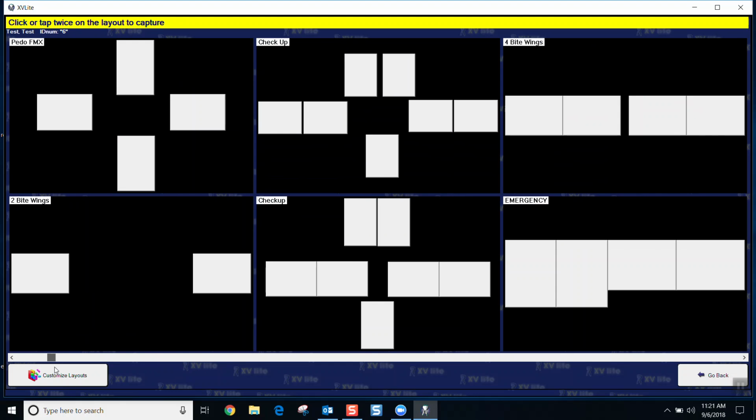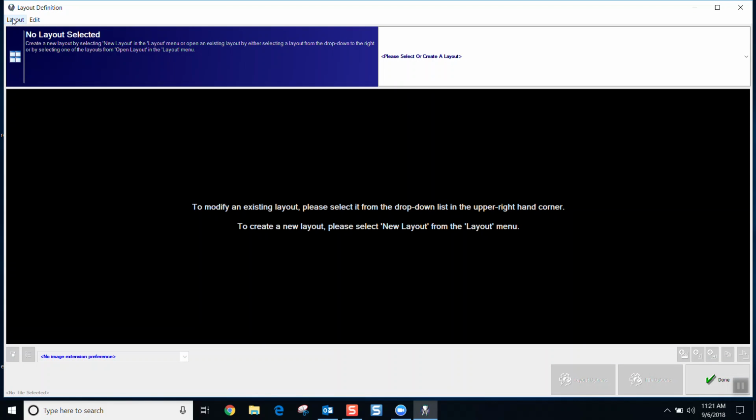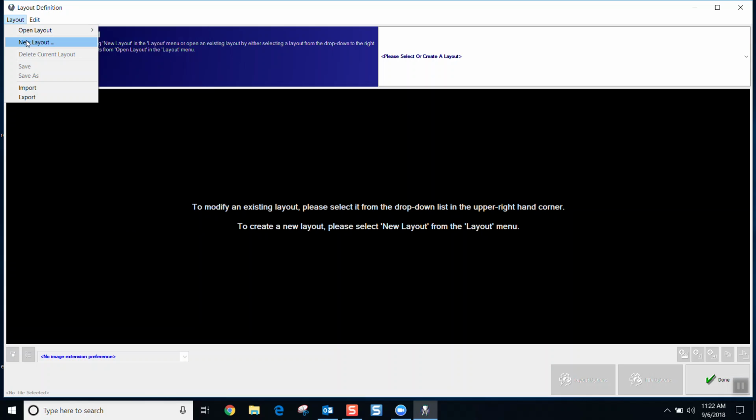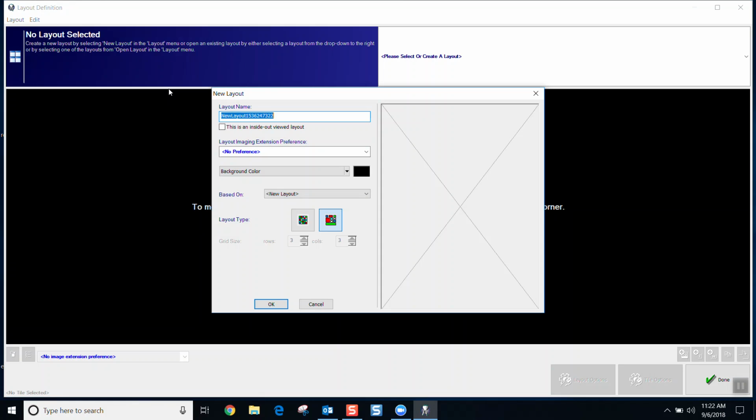But if you want to create your own, we could create layouts and open a layout if we wanted to modify that in some way. A new layout, let's just call this an emergency exam, even though we already have that one here. Call it whatever you want, say OK.